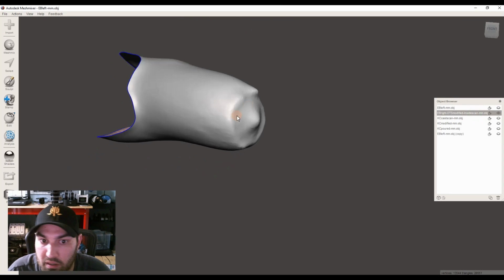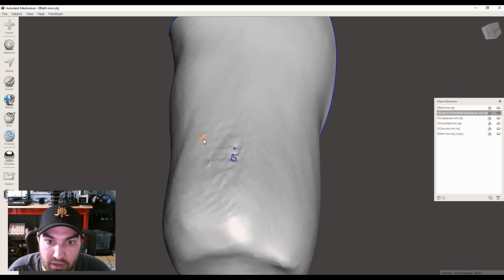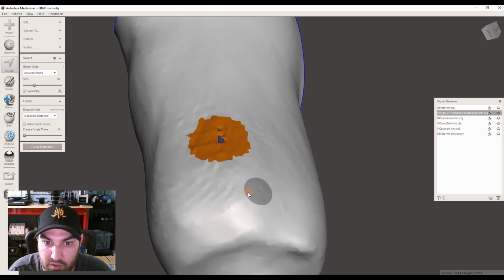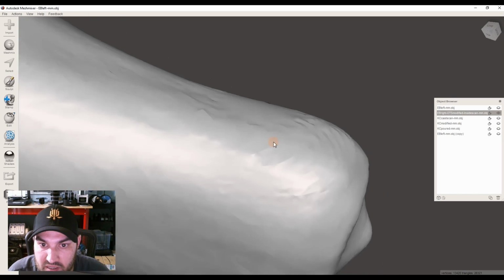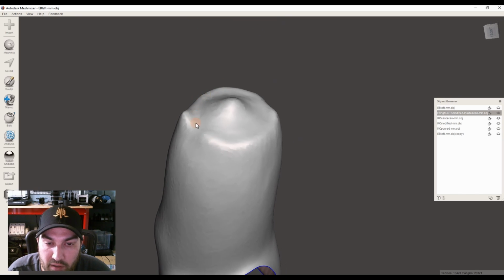So we can do that there. Same thing, we can do that here. If we've just got an area of some roughness, maybe with some holes, say there was a bunch of holes around, this is a quick way to do it. Hit that, erase and fill, and just kind of mask clean that area up. So this is the top of my lock.